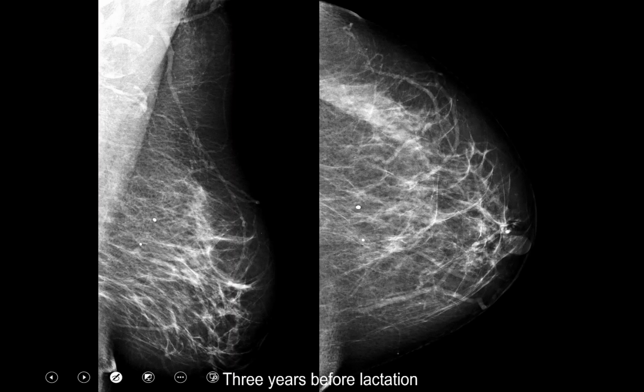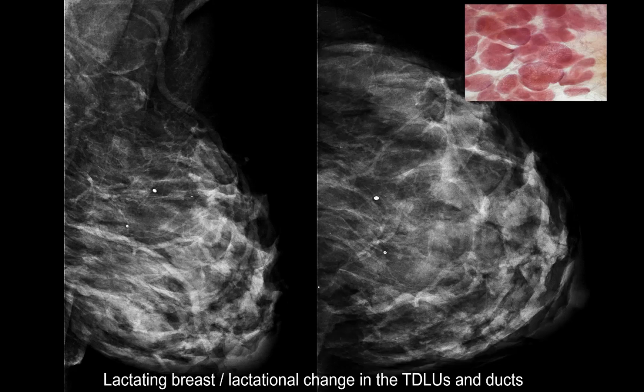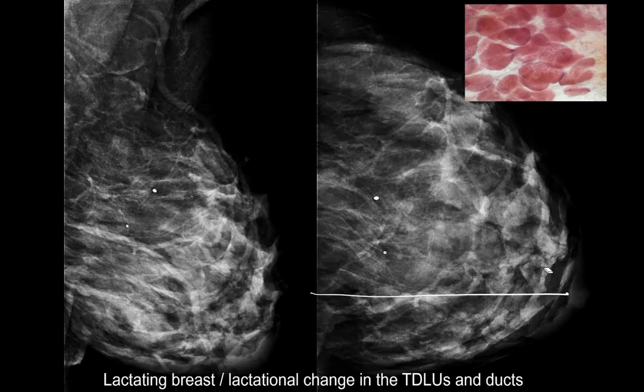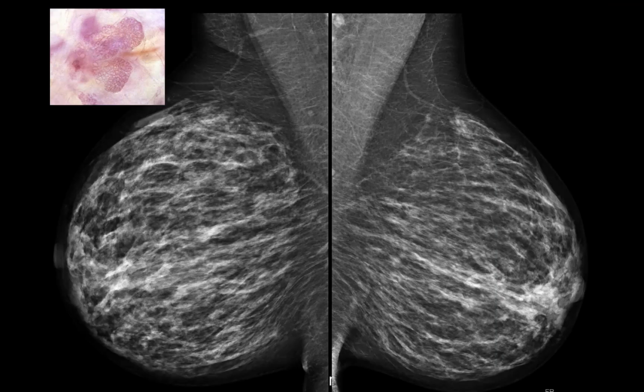This is 3 years before lactation. You know, this is wintertime. The last phase of pattern 1. And look at this distance, and now she's lactating. Same woman. Look at this distance. Back, she's going to go back to this after lactation is finished. She's lactating too.